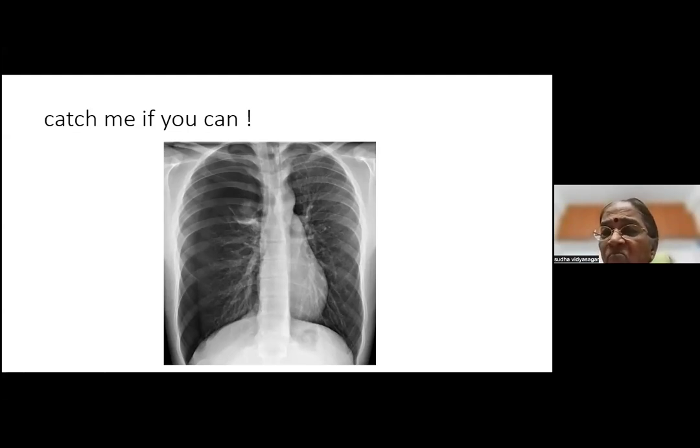Where? Which side is the pneumo? If you want to call it a pneumo, where is it? Okay, right. That's a right pneumo. Fine. So where is it a big pneumo? Huge one? Then why is your heart not shifted? The heart is not very much shifted. No pneumo. Okay, right, there is a pneumo. Look at that. That's a pneumo.